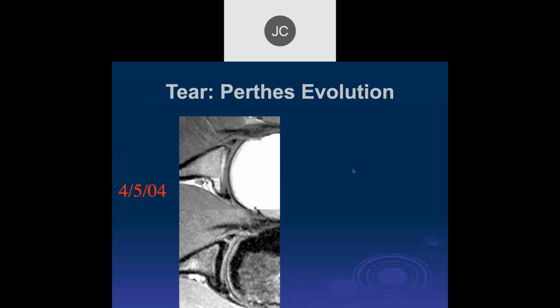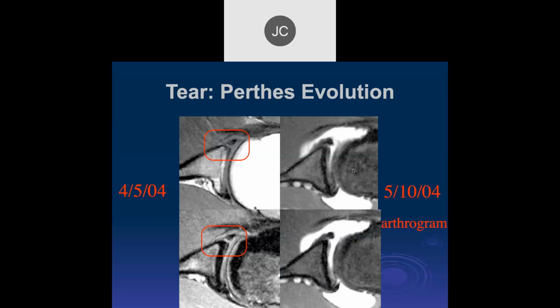Robert, what do you think of this case? Let's see. Looks like there's a tear of the anterior labrum at the base. Okay, so this is on 4/5/2004, and now the patient came back a month later, and this is what it looks like.